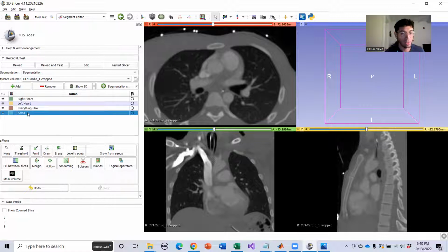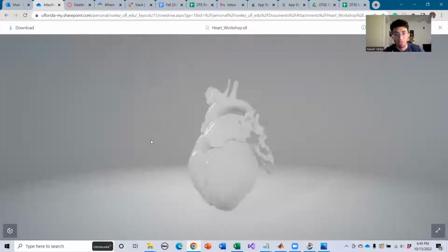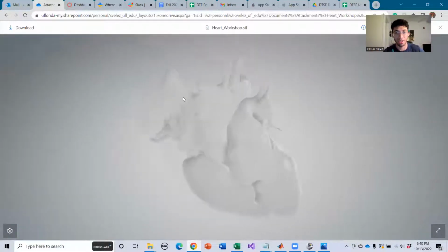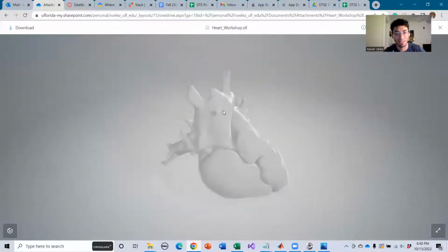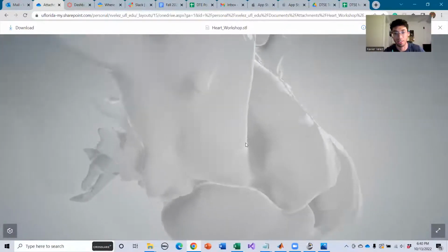And we can move this up. I say that only because in this model, for anyone who's familiar with the heart, the aorta is a pretty big, I mean, everything's important, but that one's especially distinct. So I think it'll be cool if we can try to segment that separately as well.